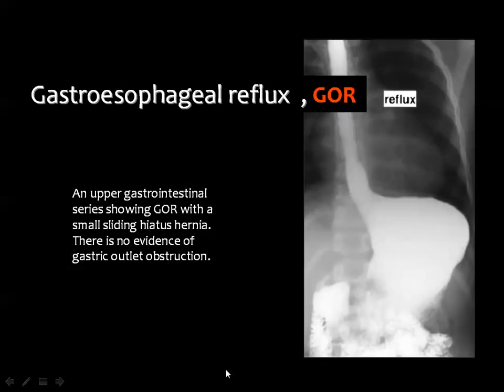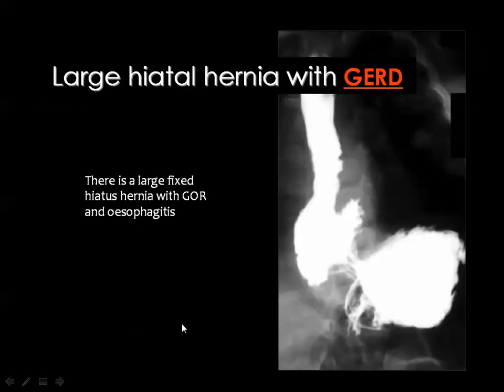Then during normal conditions, after the child swallows the food or barium, there should not be residual barium in the esophagus in the resting phase. But if you look under screen control, and you see barium is almost totally filling the esophagus, or even filling the lower part of the esophagus, then you consider the possibility of gastroesophageal reflux.